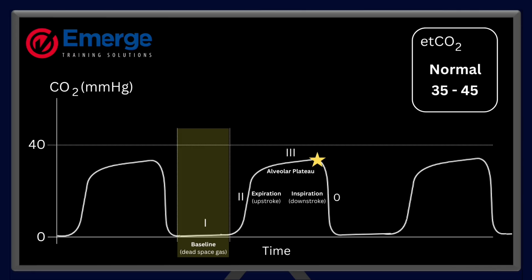The waveform begins here at phase 1, this flat baseline. The gas being sampled here is dead space gas. It's air that's been in the conducting airways but hasn't actually participated in gas exchange. That's why there's essentially no CO2. It reads close to zero.